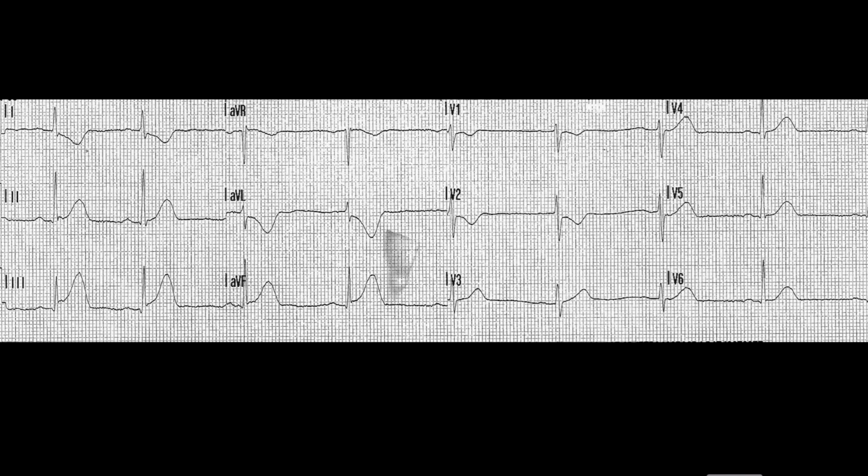So this is a pre-hospital EKG. There's no rhythm strip, but we will be able to figure it out. It's still a 10-second strip. We can still calculate the rate off it without having to look at the computer. Let's see how close we get.